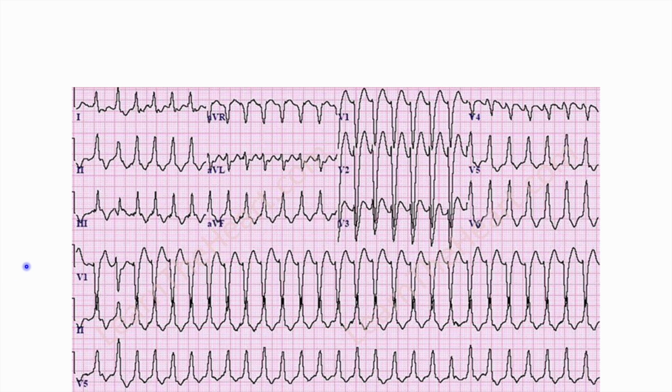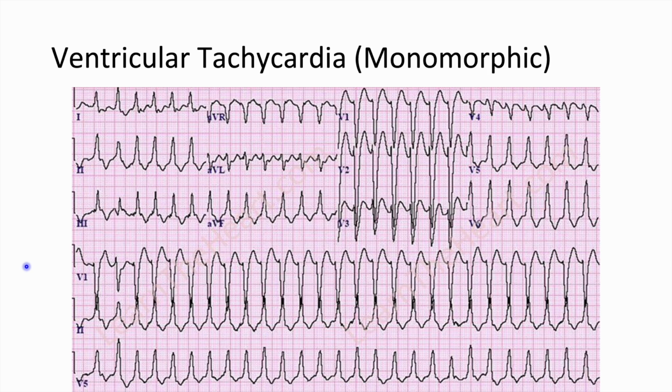3, 2, 1. This is ventricular tachycardia, and that can be monomorphic or polymorphic. With ventricular tachycardia, or VTAC, you're just going to see tachycardia of the ventricles. So you just see spike, spike, spike, spike, spike. You can recognize it by this spike here, boom, boom, or the negative spike here. This is one you need to recognize because it's common and it's tested a lot. It's monomorphic because this looks the same every single time, pretty much. And so that's a VTAC monomorphic.